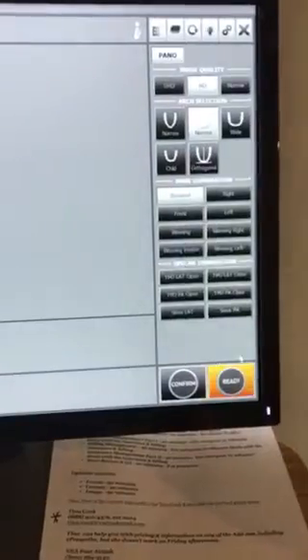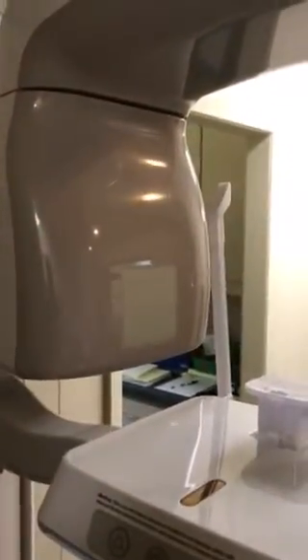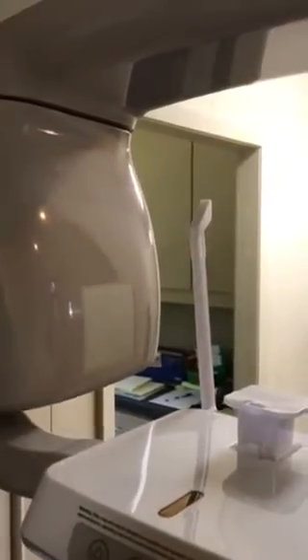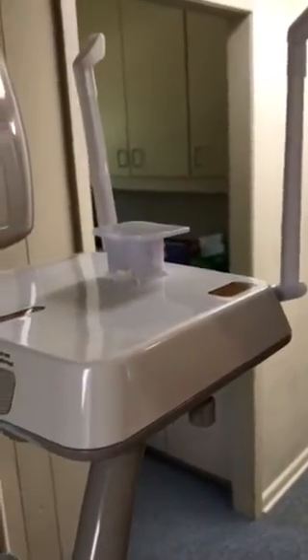So you'll come down here and you'll see the software says ready. All right, we click ready. It's going to move into capturing position. Please wait. Okay, and I don't have anything in there, but we're going to take a shot and it'll come up a black screen, but you'll see what happens once the patient has taken an x-ray.